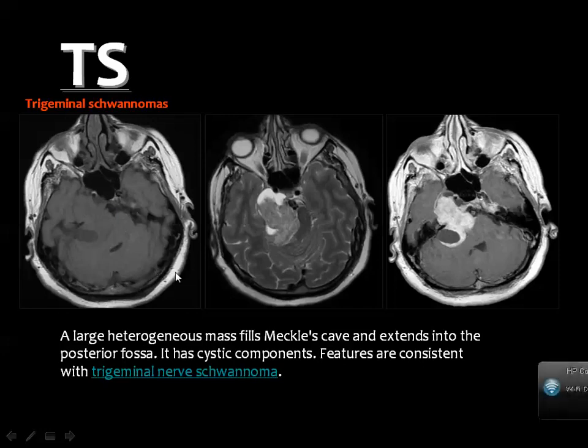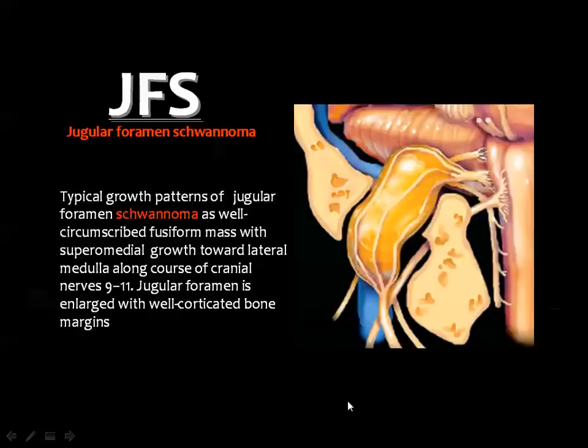And if you remember, we have discussed many of the diagnostic signs for this schwannoma in the section for the parasellar tumors. And here you see the lesion is of intermediate signal in the T1 and T2 with heterogeneous enhancement. The cystic component does not enhance.